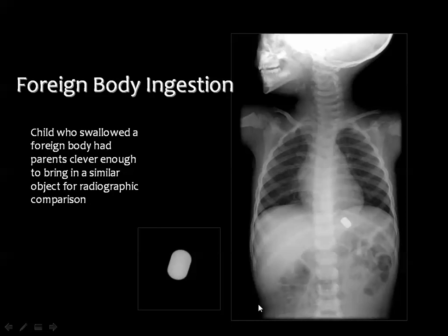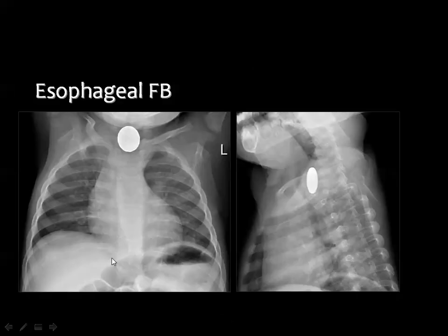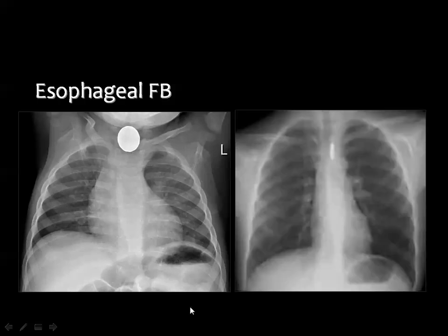And foreign bodies are commonly seen in children either in the GI or in the respiratory tract. And you can see if the foreign body is radio-opaque, and you can see it by the plain film. And if you see a coin like this in the frontal X-ray en face, this indicates that this coin is present in the esophagus, because coins in the trachea are seen by the lateral side of the coin, but the coin in the esophagus will be seen en face like this.